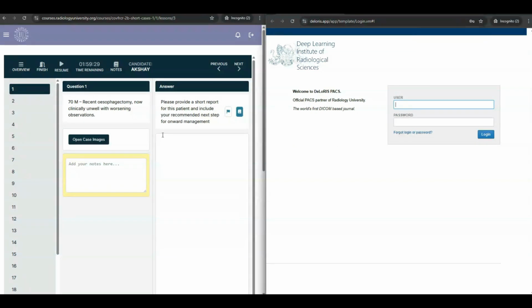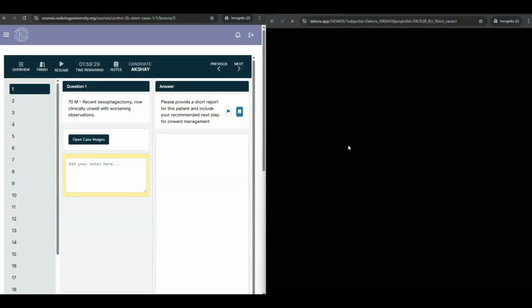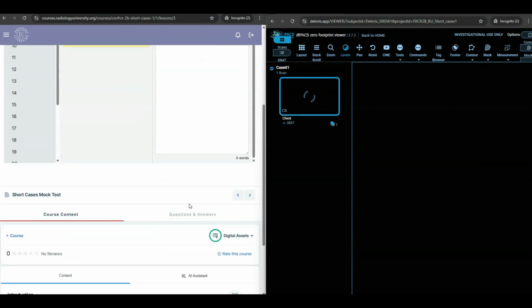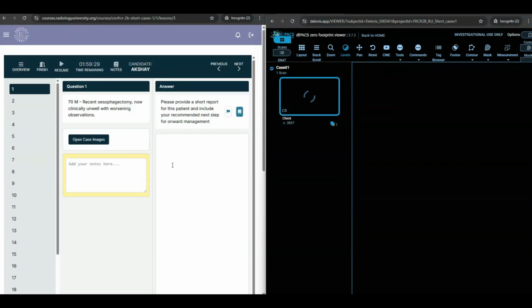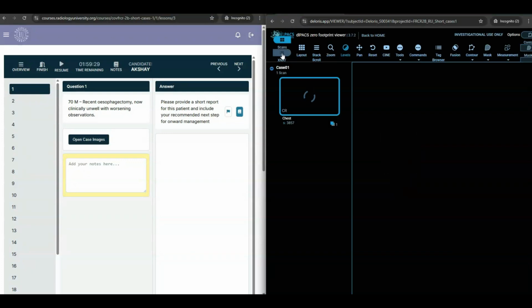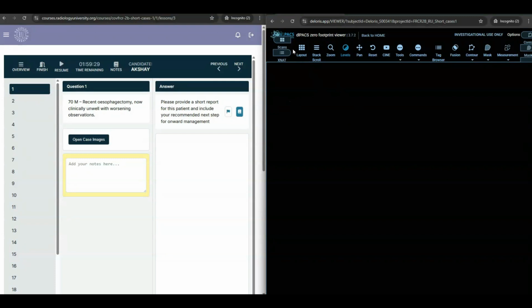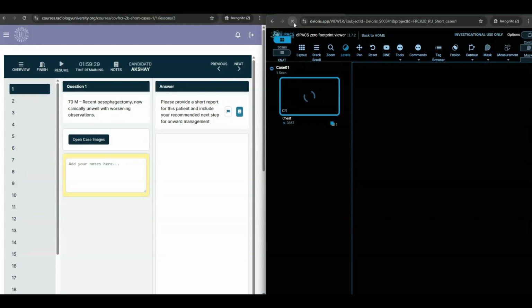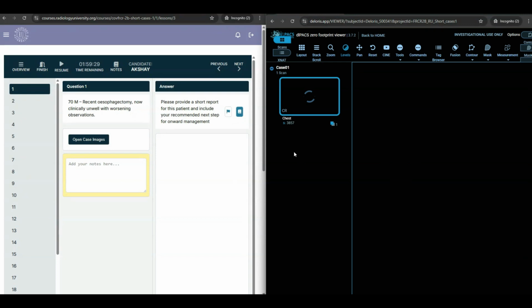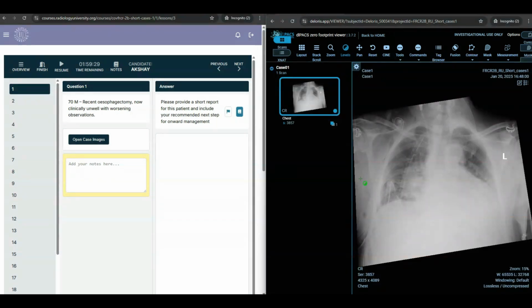So what we are going to do is, yes, I put in the credentials which we got on the first page there. Once you're on this page, I would avoid refreshing it. I would avoid clicking on next before I complete everything. So give this a minute. You can click on this window so that it will hide it, and you can click it back to see the number of cases there. It might need a bit of refreshing depending on your speed, and it should load. So now it has loaded.